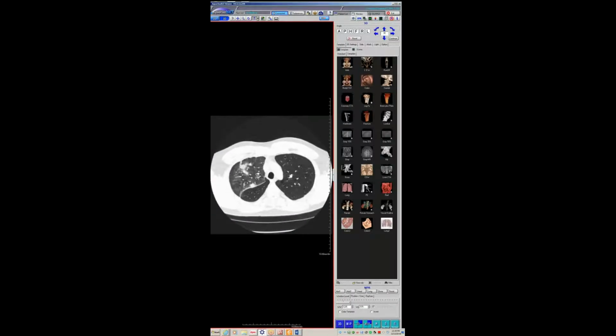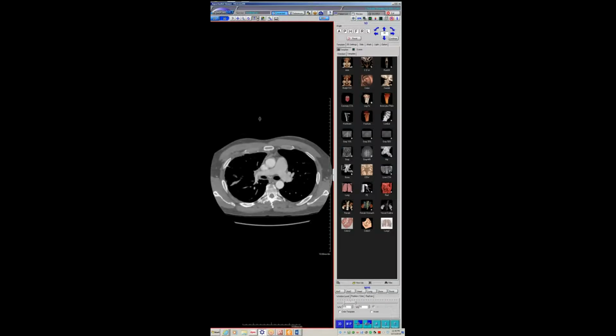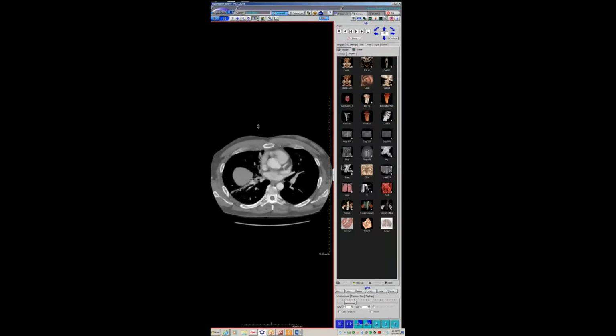Yep. So presumably he's somehow infarcting that right upper lobe. And normally, to have a pulmonary vein knocked out is usually not a big deal. Normally you get good flow through the adjacent inferior pulmonary vein, which in this case is widely patent.